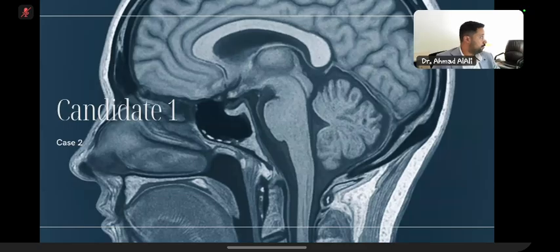Okay, case number 2. So this is a patient who came with back pain. I will share it with you.